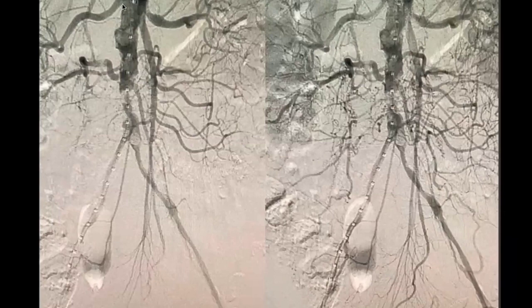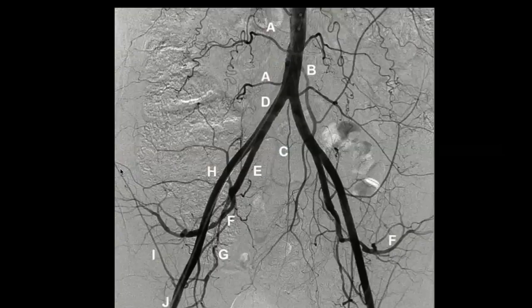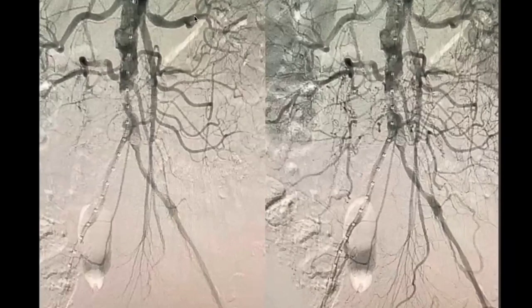So these are the renal arteries. The renal artery, remember, this is not this patient. This is not this patient, okay? So this is higher up. So you can see renal artery, left renal artery, right renal artery. So if this is coming off at the level of or above the renal arteries, what artery is this?